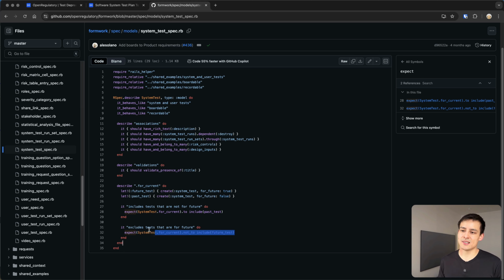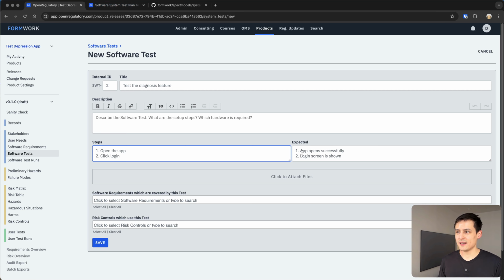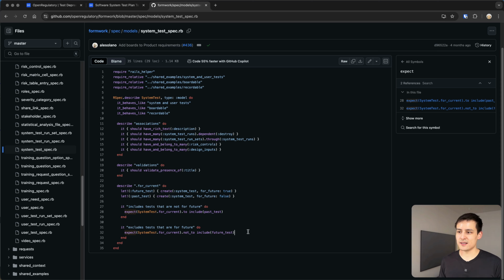You would have to probably write these out in human language further below. I mean, you could export this, but for more complex tests, this will become a huge mess. Many tests are not one-liners like this. Do you get the expected and actual results? If we were defining multiple steps here, we would need to output that in human language, and we would also need to output the result in human language. And no, we don't get this.